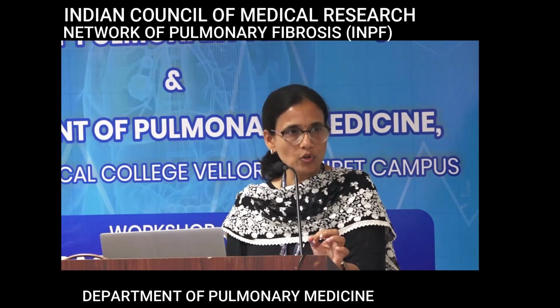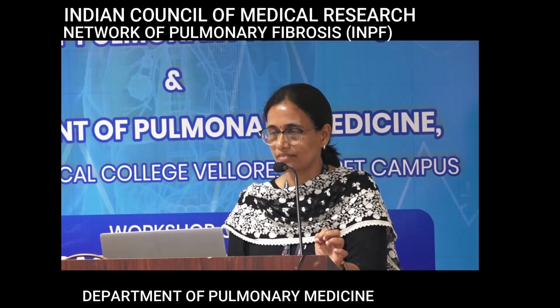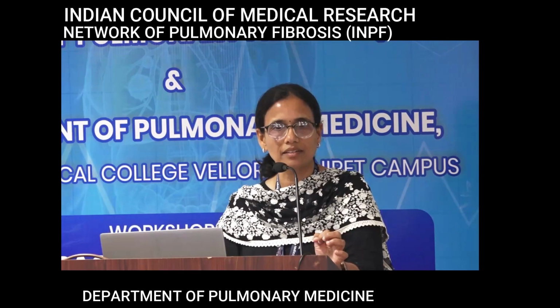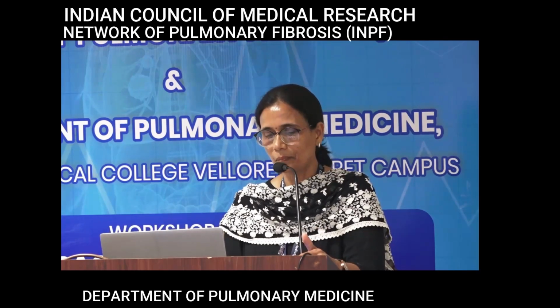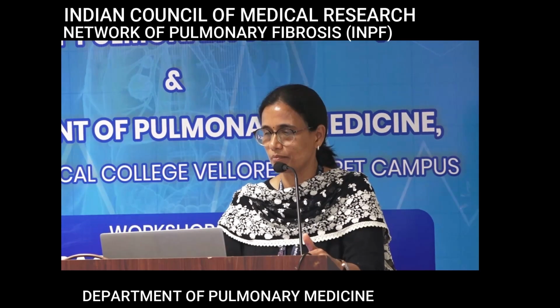They are pleural plaques. So multiple pleural plaques are there, and this one is almost calcified. Sorry, I didn't put the mediastinal window. So now what does it make it? Basically, calcified pleural plaques are there along with the fibrosis and honeycombing. So this is alternate diagnosis. Why? Yeah, sorry, here is the calcified plaque on this image.